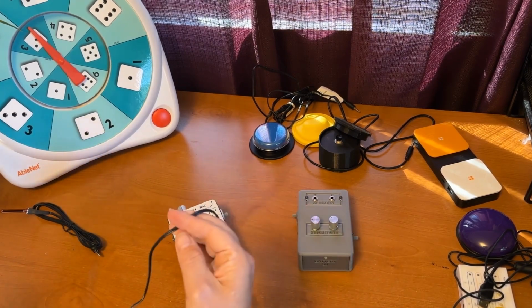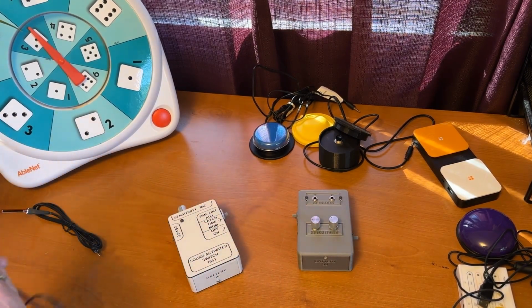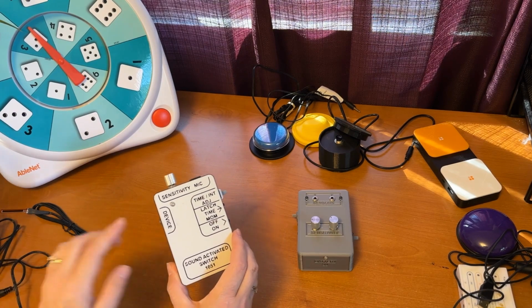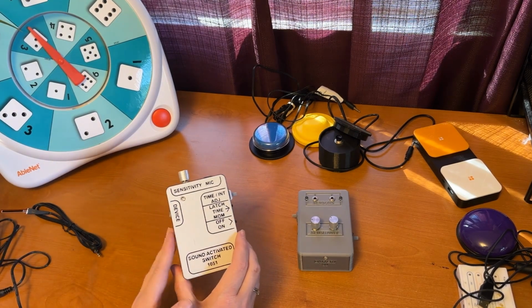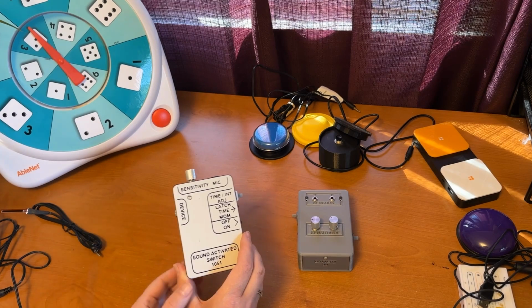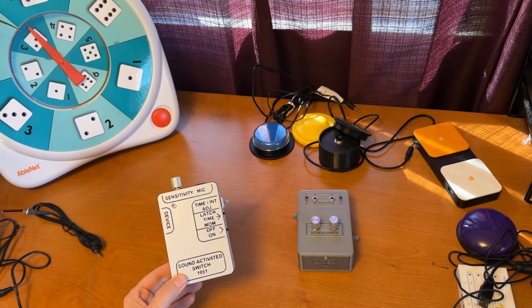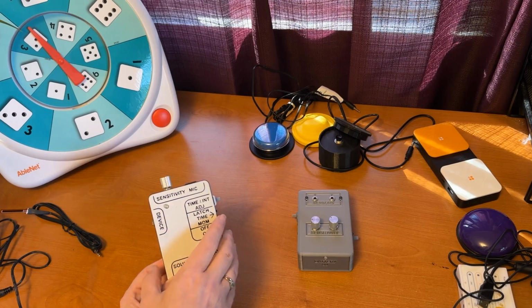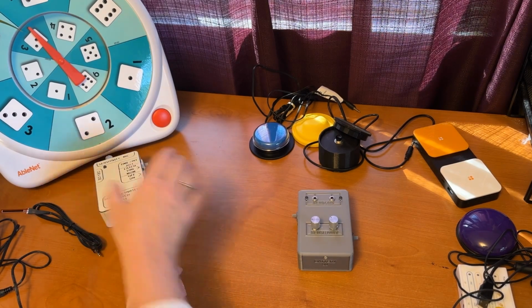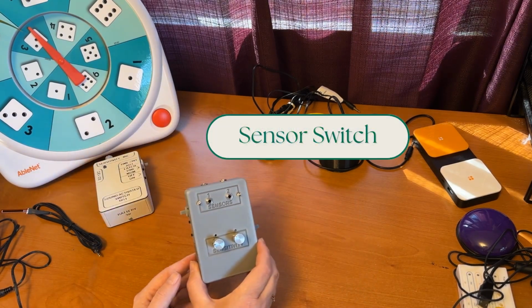So I'm just going to plug this from one end here and one into the other device. And this time when the user makes noise, it's going to trigger the switch. So now instead of pressing something, we're simply going to have the user make noise, and that is going to trigger the switch.